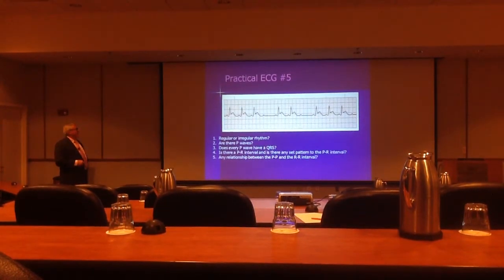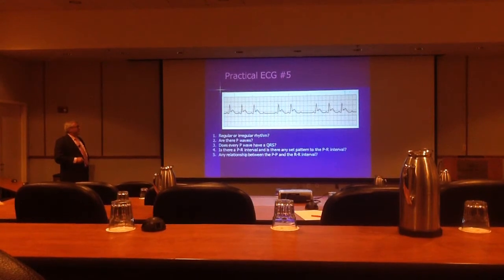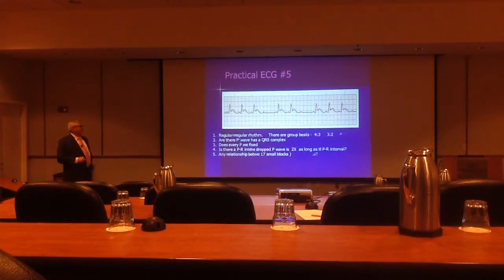Why? PR interval is fixed. A P wave that drops. This distance is a multiple of this distance. That makes it a second degree type 2.